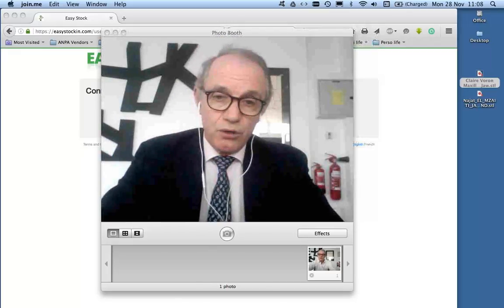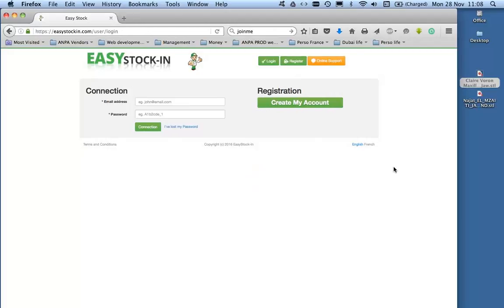So let's go, and I'm going to show you how we can go into EasyStock-in. To go into EasyStock-in, the first thing you have to do, if it's the first time you're doing it, and I will go very fast on that, is to create my account.